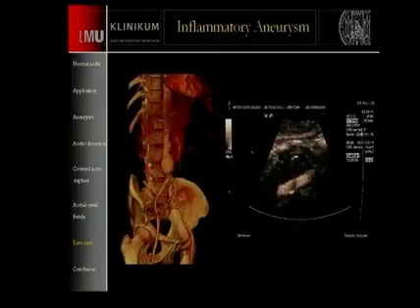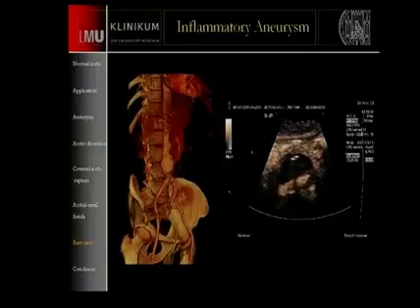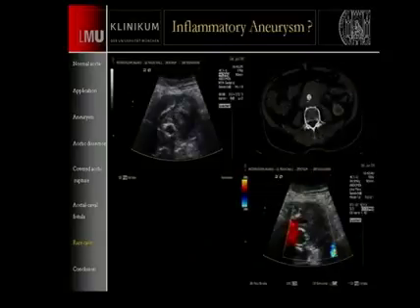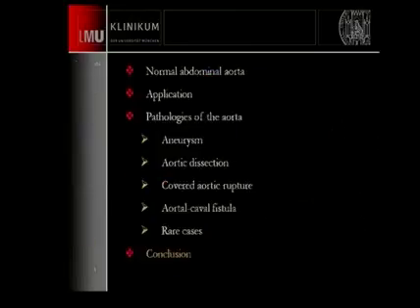This is the same patient. This was CTA, MIP, so we couldn't see it, but we see the part of the aneurysm before. And we see here the aneurysm, and this is the wall uptake, and this was the stent graft. If I compare it, you can make measurements inside here, and then you get this nice curve, which you have already seen in the kidney diagnostics, and then you compare the changes side by side.